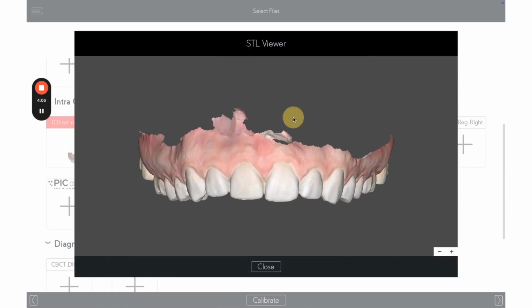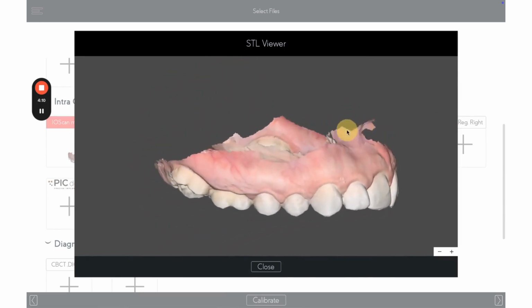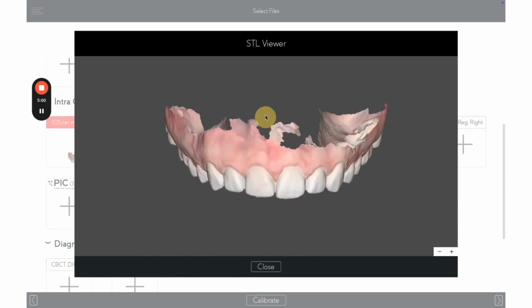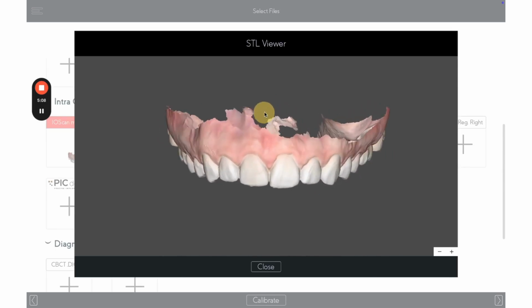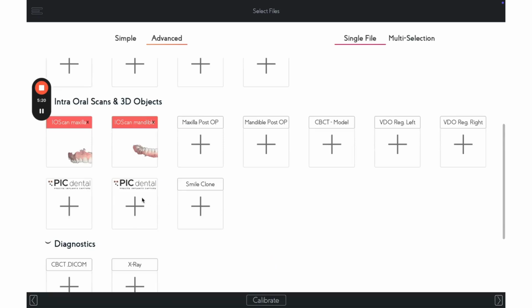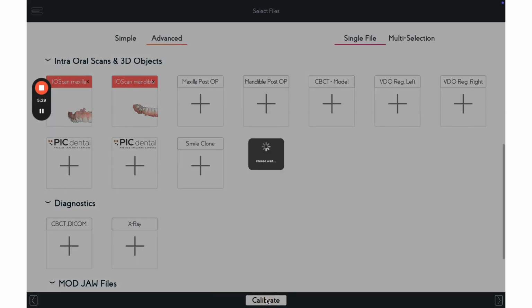Now notice that my intraoral scan is open. It doesn't have a base. It means the files are not ready to print. You do have the option to export the files closed as well. If you export them closed, you don't have to close them in the SmileFy app. So I'm going to close the models in the next step. And for that, we need to select Calibrate first.